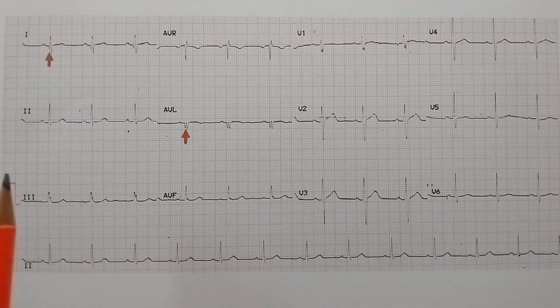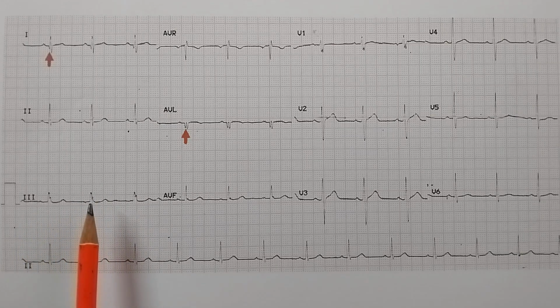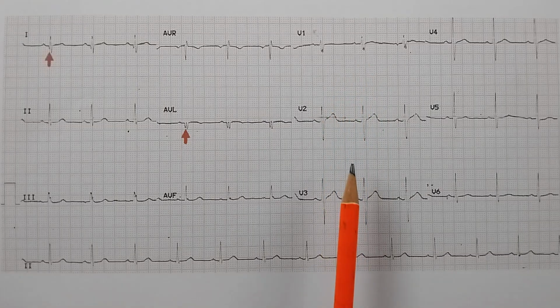Anyway, this is another recent finding. That is, you can see a notching in the QRS here. If it is in a person with atrial septal defect, we would have called it the Crochet sign in atrial septal defect. You can see notching here also. This is also notching, the downslope as notch. These notches in the setting of myocardial infarction, they are called fragmented QRS. Fragmented QRS. That is abnormal conduction occurring in the ventricles.